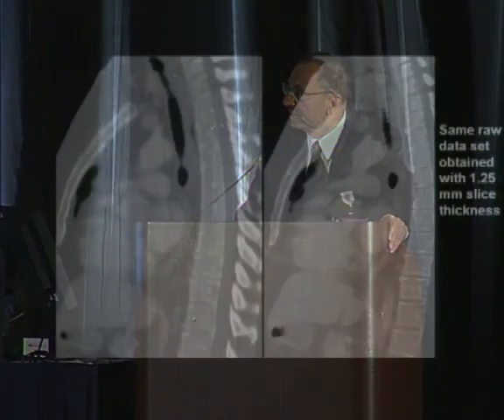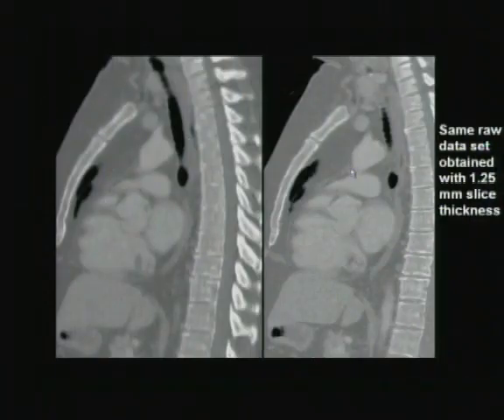This set of images and this set were taken with the same parameters, and the technician sent me this. I asked, why did you send me this? Because this is what I sent the chest radiologist. But I knew what I needed, so I asked her for, this was the thickness, so I asked her for reconstruction at 0.5, and she sent me these images, which I think all of you would agree are better for studying bones.